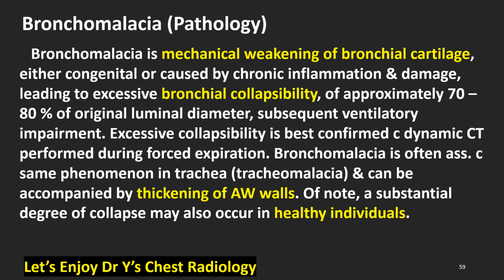Excessive collapsibility is best confirmed with a dynamic CT performed during forced expiration. Bronchomalacia is often associated with the same phenomenon in tracheal malacia and can be accompanied by thickening of airway walls. Of note, a substantial degree of collapse may also occur in healthy individuals.